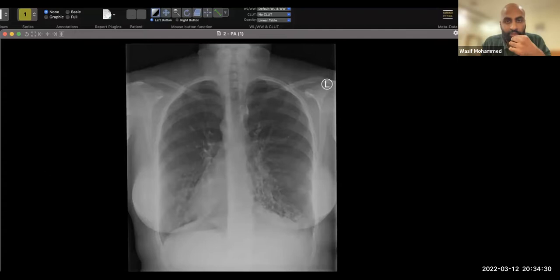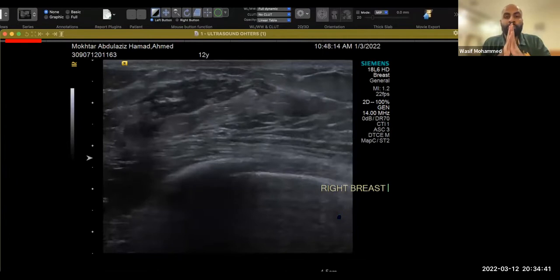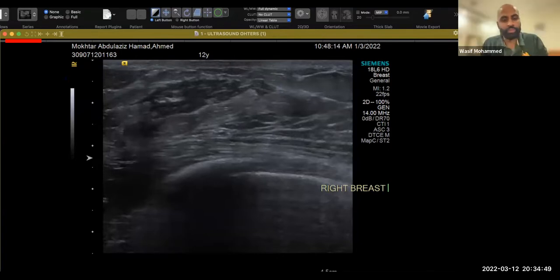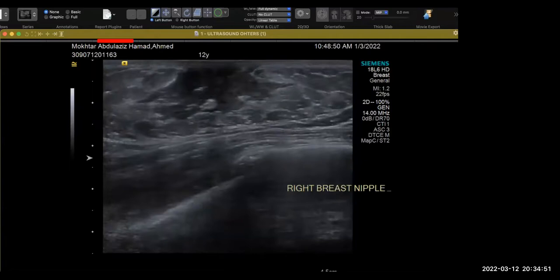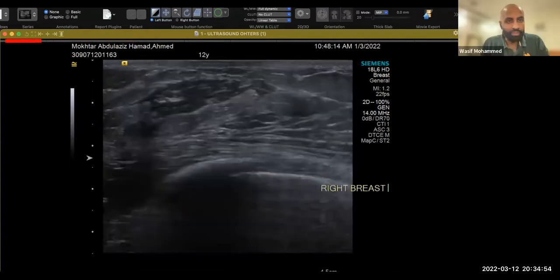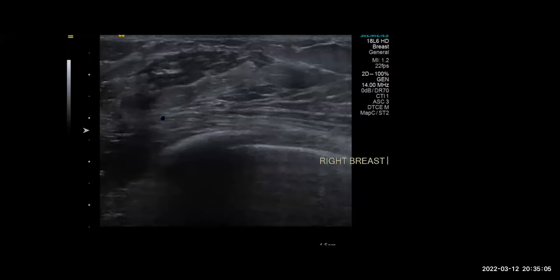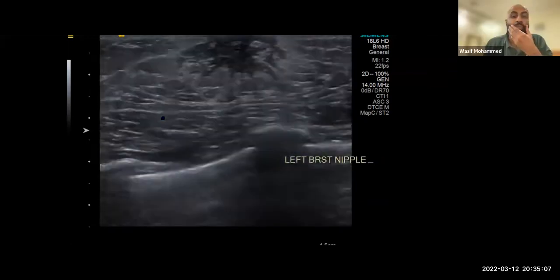That's fine. Okay. So just go through these images. Okay. Just 1 second, sorry. Yeah, I understand. Just give me 1 second. Sure. All right, now go through the images. Okay, I'm not able to scroll. Fine, I'll scroll for you.